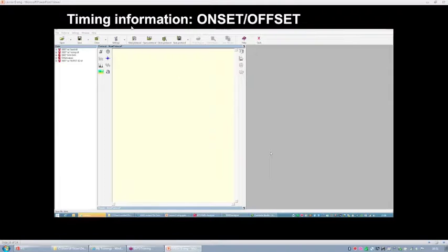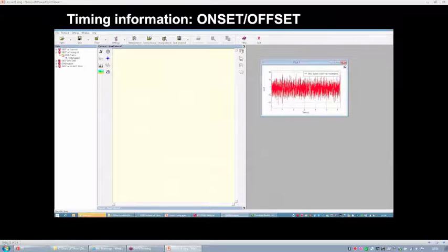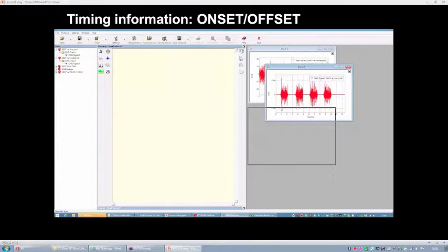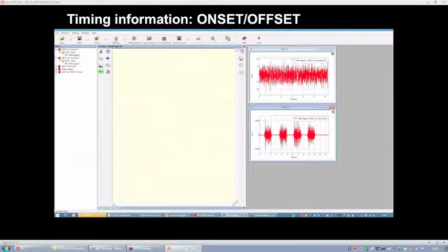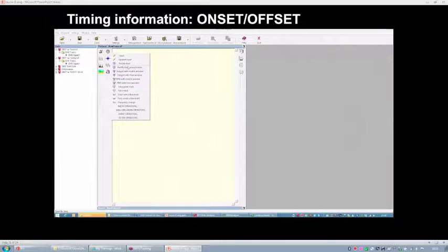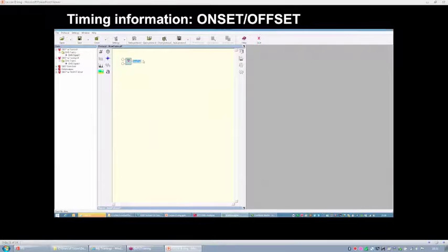So now I want to show you an example of how you can do it in the EMG analyzer application. So now we will use this resting trial. On the first image, you can see the resting muscle activity. Now I'm going to compute the mean value of this activity.